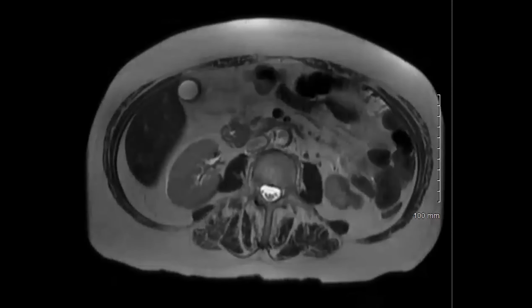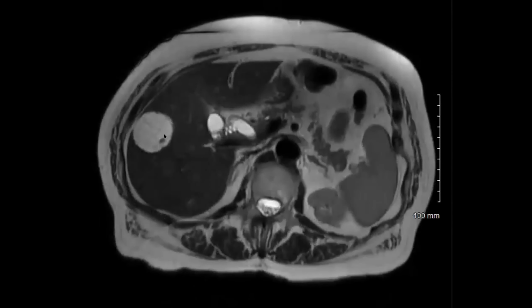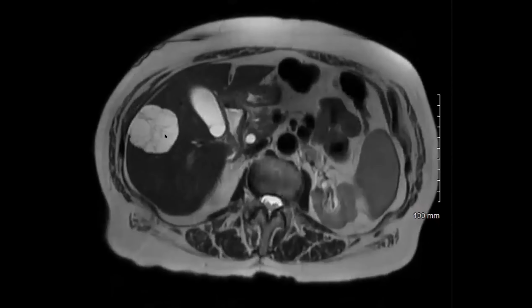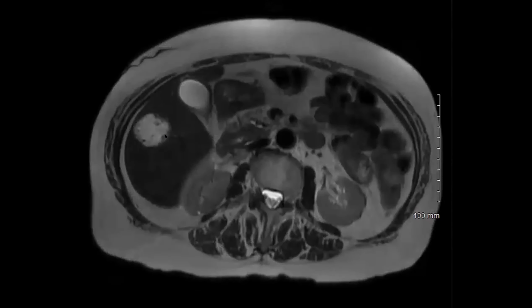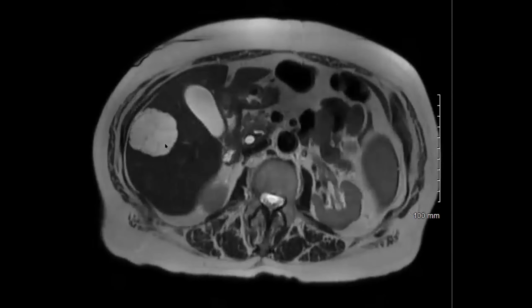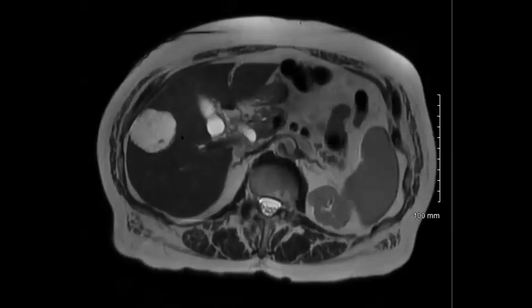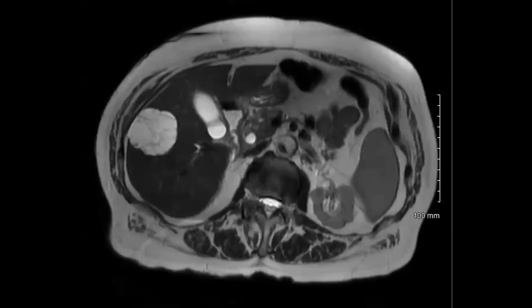So that paper that Cookie and Sudarka wrote talks about how you separate an MCN from a biliary cyst. Lobulated margins are usually good for biliary cyst, but you've got to look at the septations. If it goes to a marginated indentation, then that's fine. But if it goes to an area that's not indenting, like I see lots of septations that are not, then you think about MCN. And then IPNB. Was there a new ductal dilation? I thought one of the ducts got a little bit chunkier.